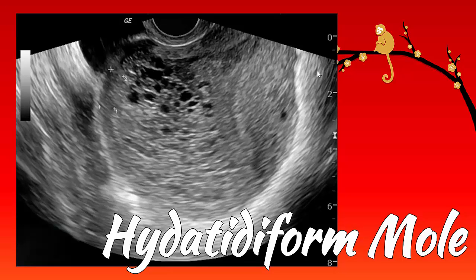I think it's fairly unlikely that this is going to come up on the exam, but just to be familiar with it, this is the snowstorm appearance of a hydatidiform mole. The question stem in this instance is likely going to provide a patient with hyperemesis, and potentially they may have an abdominal exam that reveals a uterus enlarged for gestational age. Again, I think it's less likely this is going to pop up, but just so you're familiar in case it does.